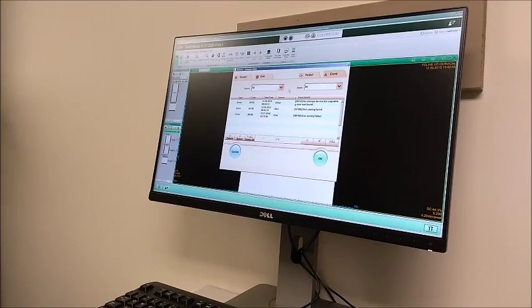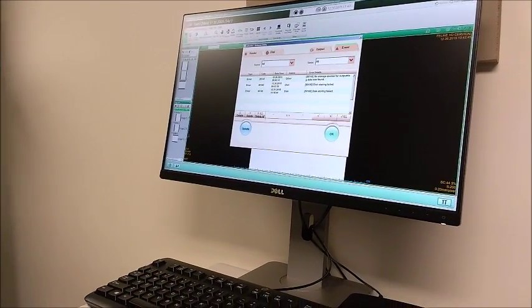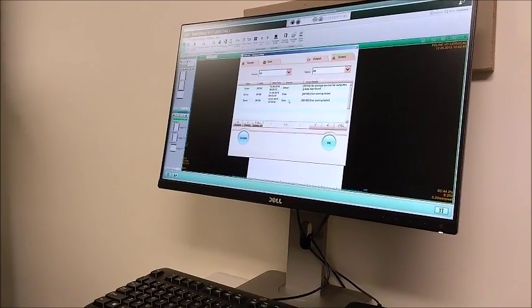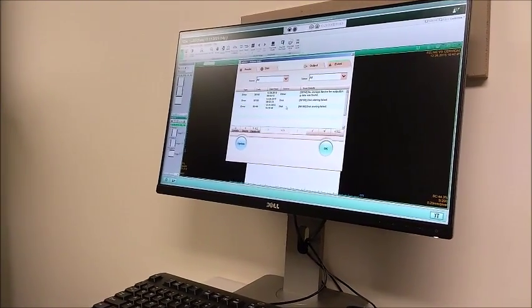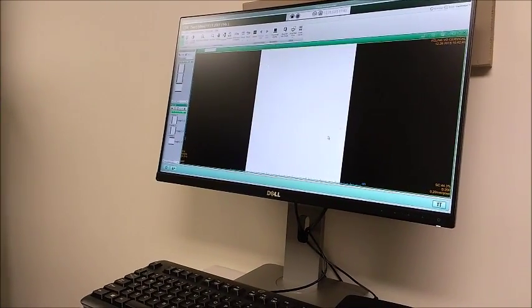You can call, and I'm going to ask you to go in there and tell me what the errors say. Okay. And then I'll say, don't delete them all, just check them all, because we like to keep the error log here, and you'll be able to come back and tell what was happening. So if you delete them, they'll be gone, then we won't know. Right. Okay. So then to get out of it, you just say okay.